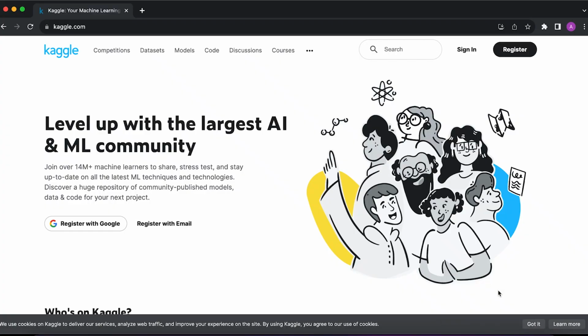Let's go ahead and go to Kaggle. It's a popular data science site that gives you an ability to code in your browser, so you don't really have to mess around with a bunch of installs and stuff. So go to kaggle.com, create an account. It's totally free, and then you can create a Kaggle notebook, which allows you to code and graph stuff and see everything, code on the fly right in your browser.